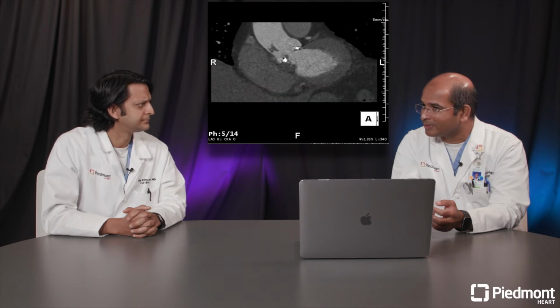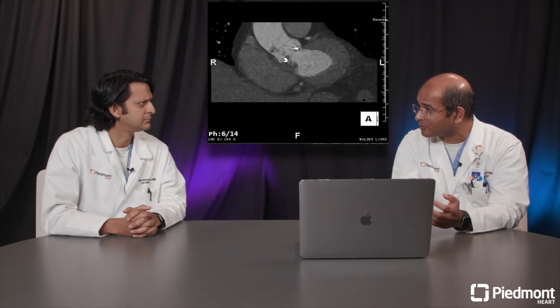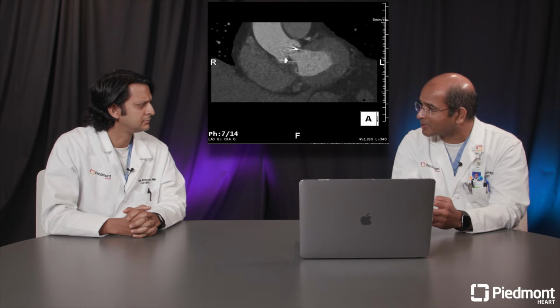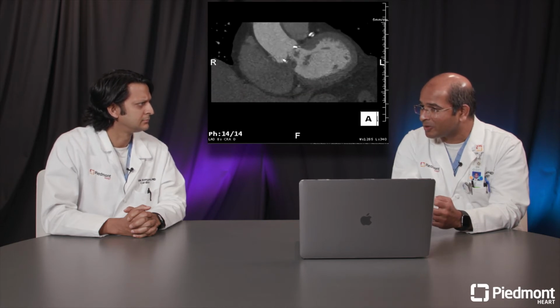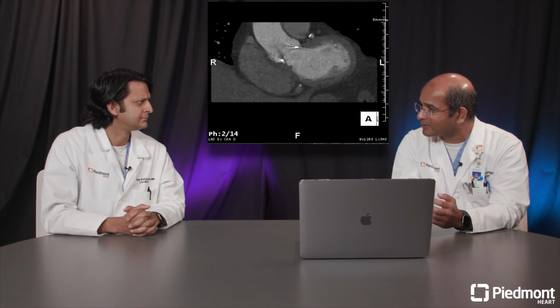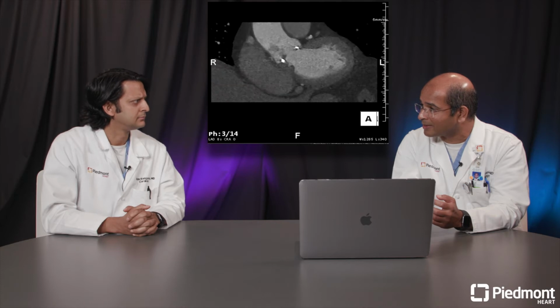And also in looking at complications of endocarditis, abscess formation, pseudoaneurysm formation of the intervalvular curtain. Because these are bioprosthetic valves, and even with newer reconstruction techniques like metal artifact reduction, you can decrease the artifact due to metal, and you can see leaflets well.